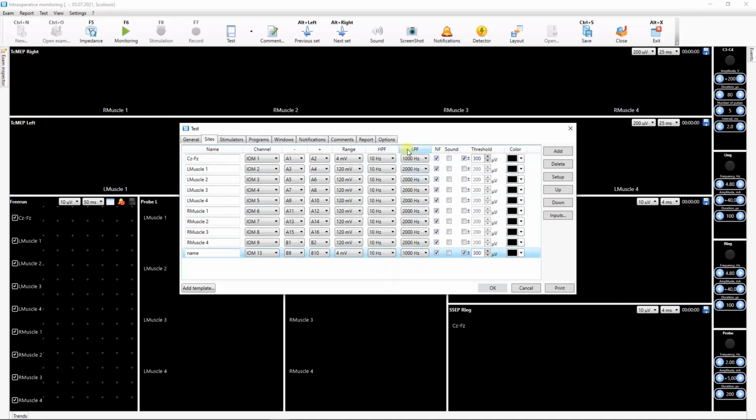lost. At the same time, a low-pass filter, or LPF, only passes frequencies lower than the cutoff frequency. Decreasing this frequency will reduce noise of the recorded responses, but may cause distortion of the trace waveforms. The combination of these two filters determines the bandwidth for the acquisition channel. The sites with different modalities require different filter values.